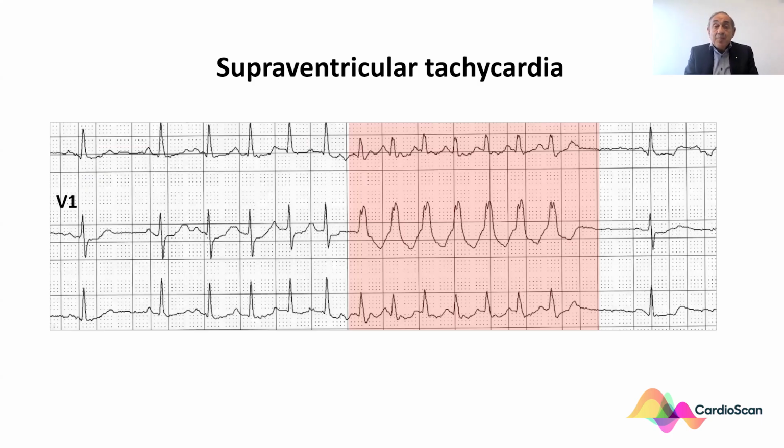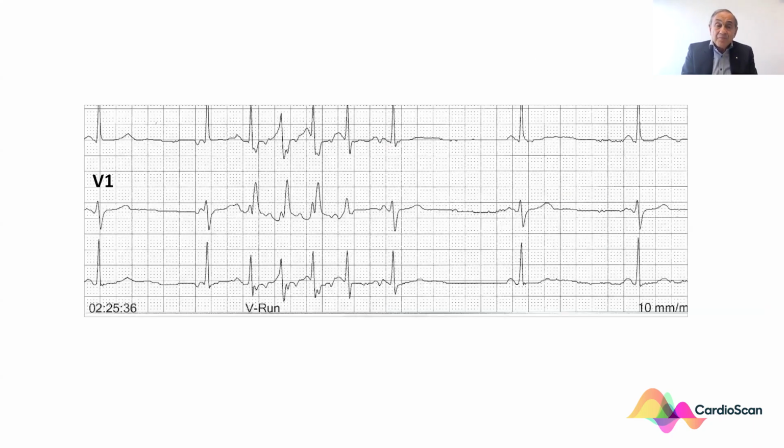Here is an example with aberration with a supraventricular tachycardia. One can see that it is V1, but it looks like a ventricular tachycardia and is of concern to the viewer. But remember, this is an RSR phenomenon. And remember, prior to the aberration, there is a rapid conduction of the supraventricular tachycardia, and as it gets slightly faster, it goes into aberrancy.